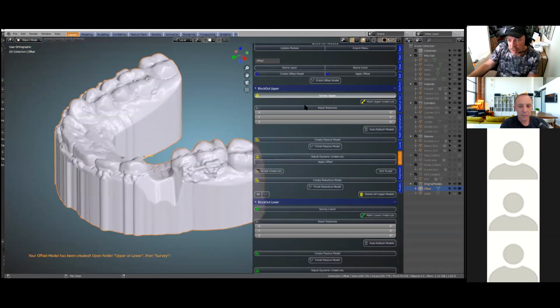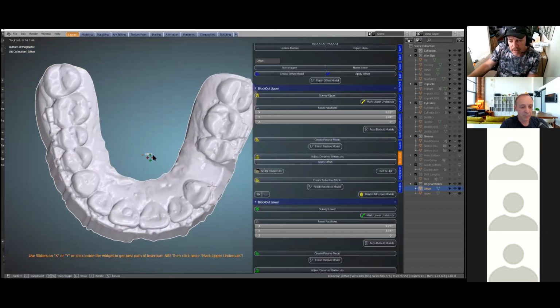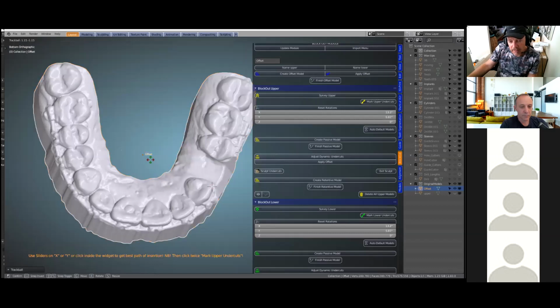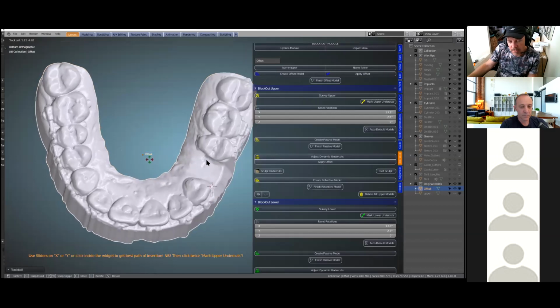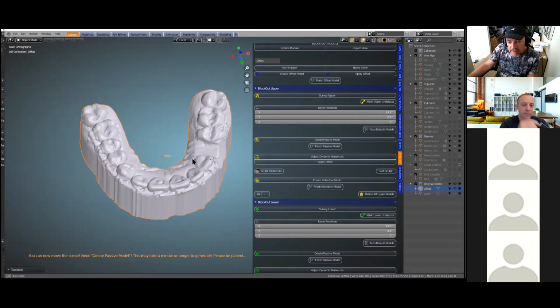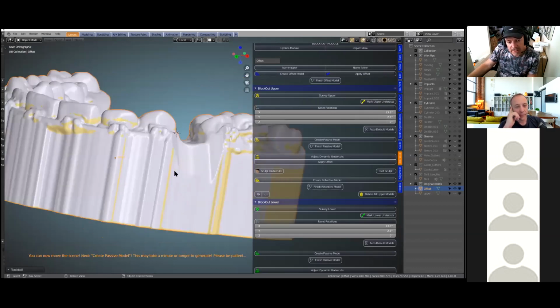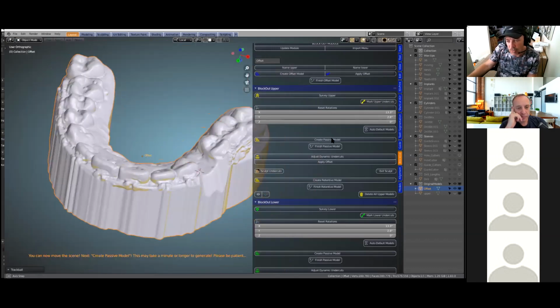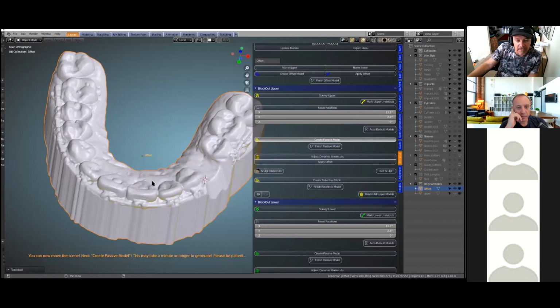So we're going to go survey upper, survey it. I'm looking at the mesial and distal of those two so that we can get a good slide in there. And we're going to mark these undercuts. And when this widget disappears, we can move the scene so we can actually see where these undercuts are. And then following that, we're going to create a passive model, which we need for our implant guide.